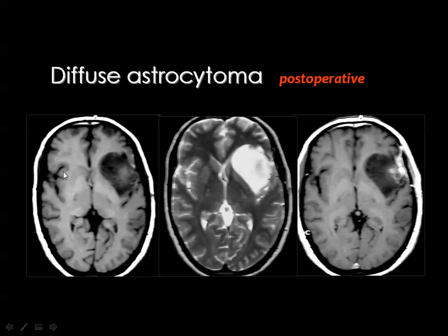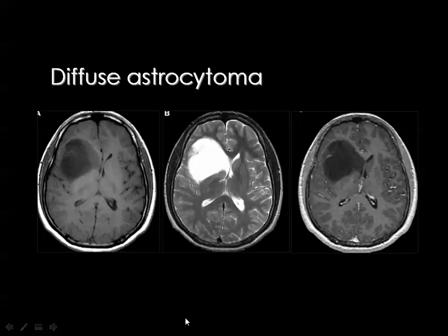And this is another tumor, and you see a low signal in the T1, high signal in the T2, and this enhancement is because of the operation. You see the operative flap, and you know that operation will disturb the blood-brain barrier. Then contrast media can reach the tumor, but if this tumor is imaged before operation, you should not see any pattern of enhancement like this one.